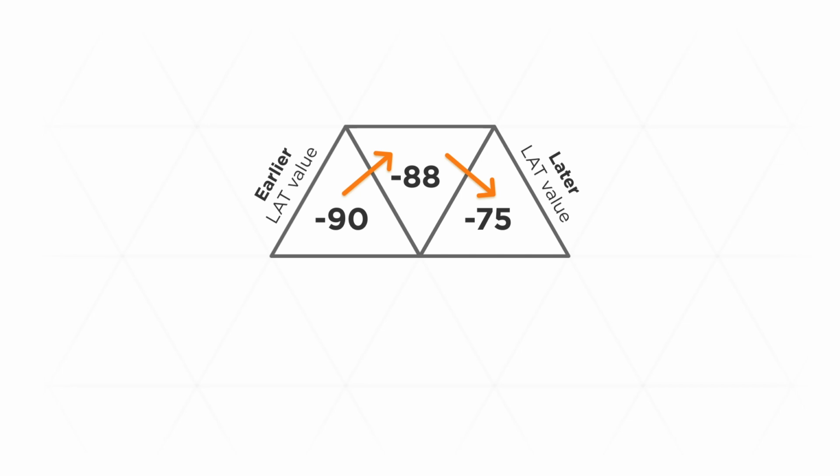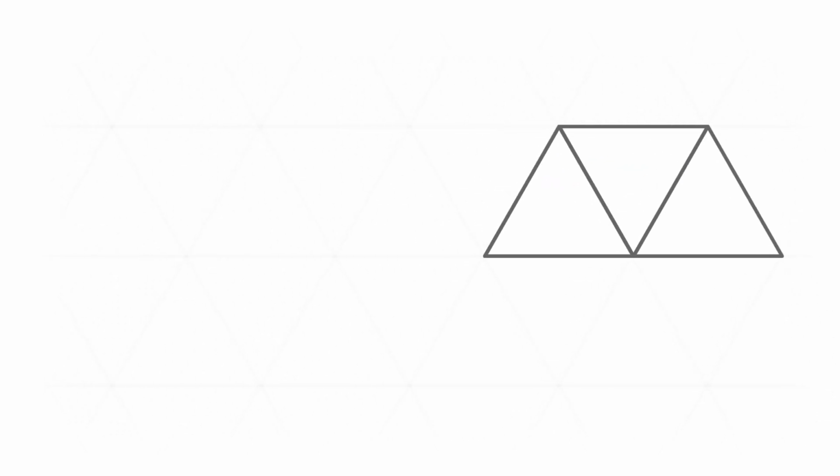In addition, Coherent knows the amount of time it takes to move from one triangle to the next. In this example, Coherent determined that the first vector is faster than the second vector. This same calculation is run over the entire map surface to determine the vector velocity and directionality among all triangles.